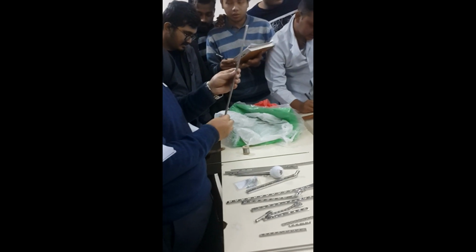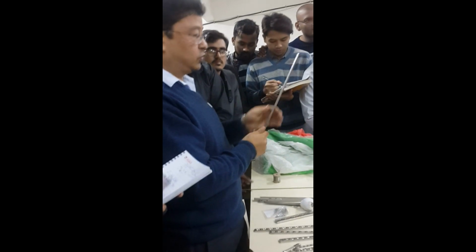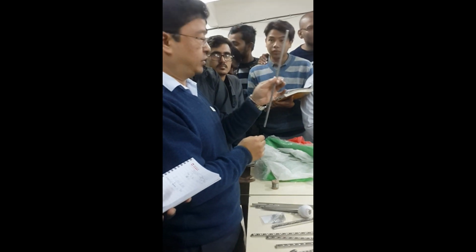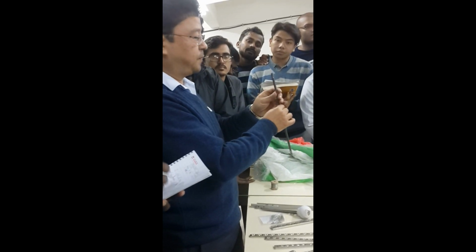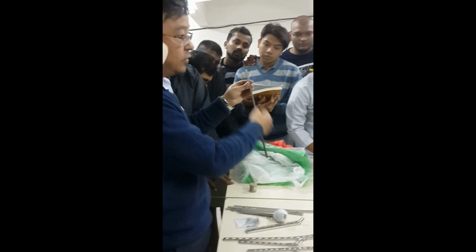K-U-N-S-C-H-E-R. So this is used for femur fracture. The speciality of this is it is not round like this. It has a slot here. This empty space is known as a slot. And at the ends there is a coil, that is known as the eyelet. And the slot is used so that the nail fits snugly when it goes down.